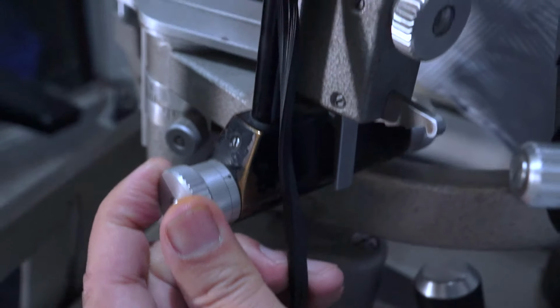Now there are filters in this one. You can see that this is a diffuse type of illumination, a scattered light over there, and then you can put a filter in this, and that is called a polarized filter, and then you can put a filter that is called a neutral density filter in this one.